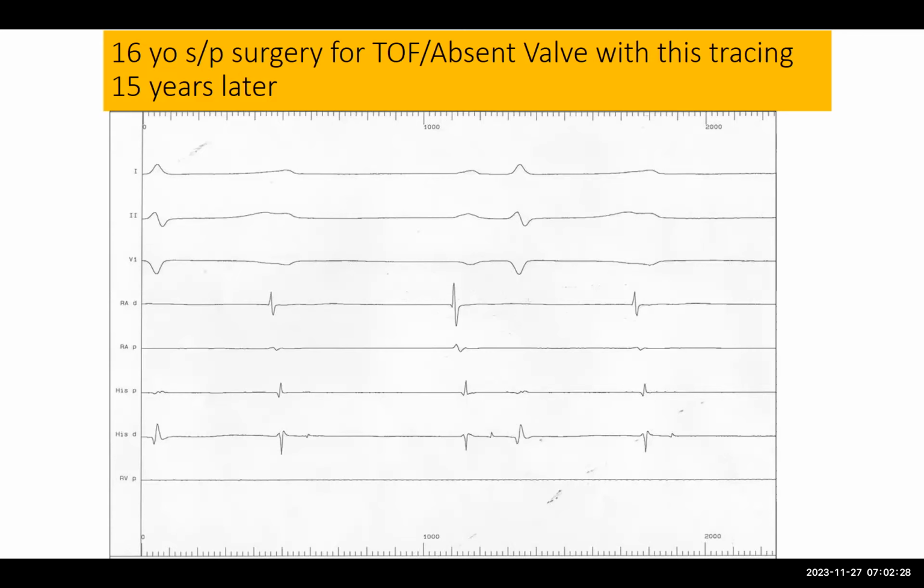Good morning. Let's see here. Since we don't have lines on the paper, let's just assume, for the sake of this conversation, that the ventricular rate in this patient is 52.